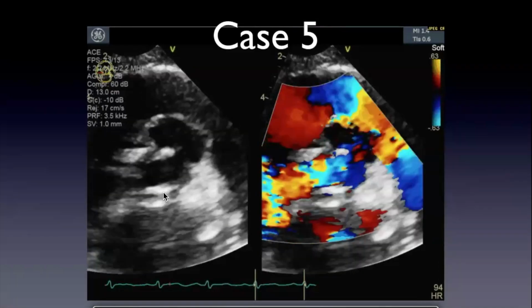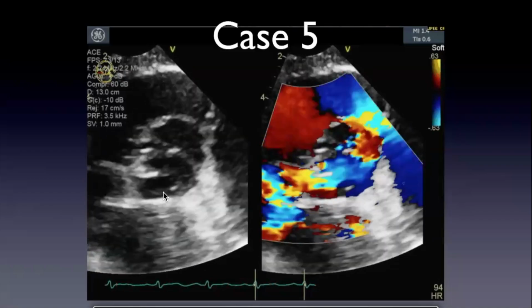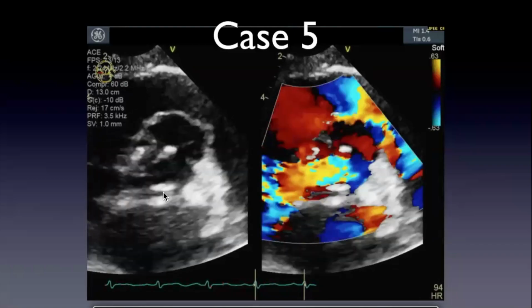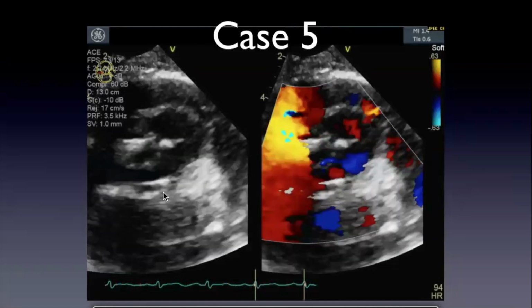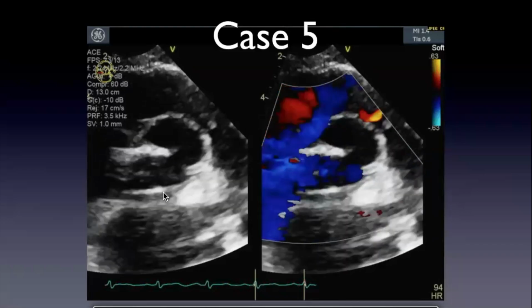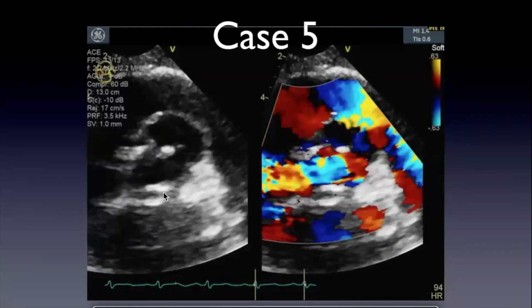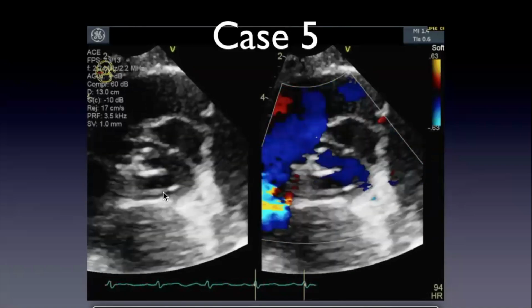Plus, the other differentiator is which chamber it is attached to. So in order to do that, when we give contrast, we have to do a first pass contrast where we start imaging. It's almost like saline contrast. We start imaging, and then we inject contrast, and then we follow the contrast through all the chambers and see where this chamber fills, if it does fill or not, in relationship to the chambers that are filling. So then you can have an idea of where the connection is coming from, which makes a difference if you had to tell a surgeon, listen, there's a leak, where is the leak coming from?